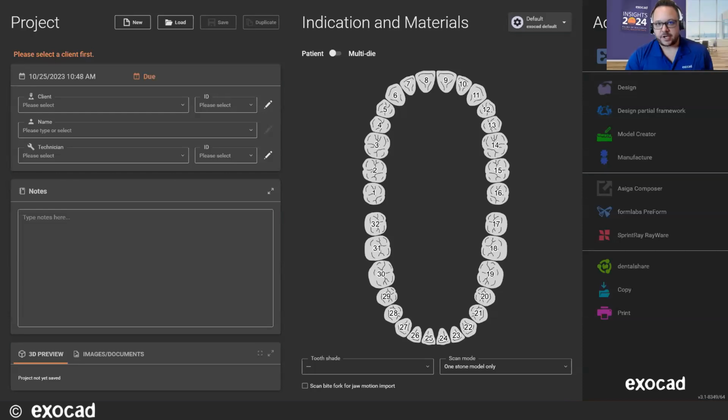So today we're going to cover PartialCAD 3.1 Rijeka highlights. There are some really awesome new features we're excited to show you.